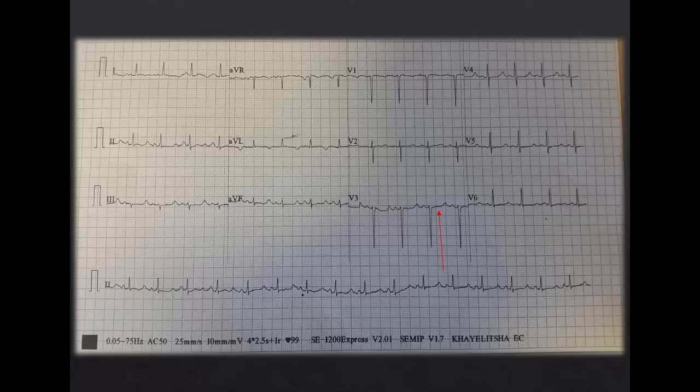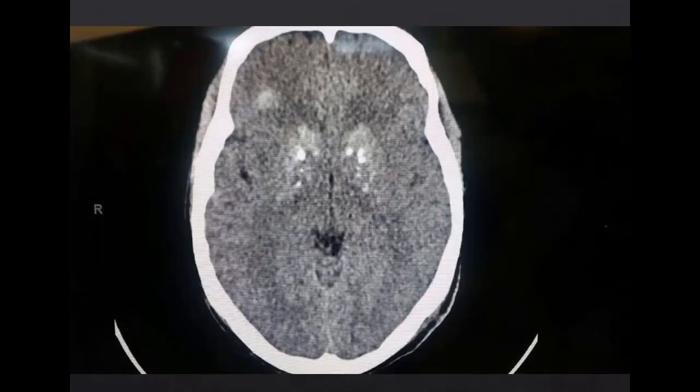And the thing we saw is that she had flattened ST segments and the T wave was pushed out. So we said, hey, this auntie is hypocalcemic. All right. So we confirmed it, and then we thought, next question is why? Why is she hypocalcemic? So we sent her across for a CT because she was still having seizures despite us replacing the calcium. And she ended up having hypoparathyroidism. All right. And the CT showed basal ganglia calcifications. As I say, electrolyte disorders are the great imitators. They can present in various different ways.